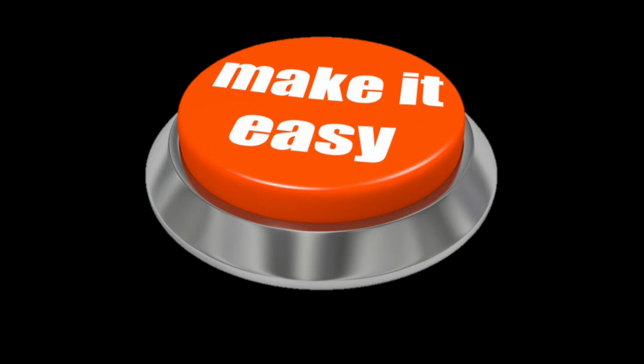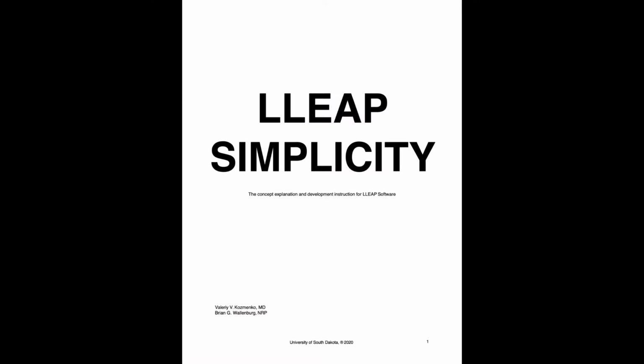Simulation is expensive, it is time consuming, and requires a lot of manpower. We need to do whatever we can to make it easy. This tutorial explains an innovative and easy to program technique that allows for creating high-fidelity, flexible, semi-automatic simulation scenarios.